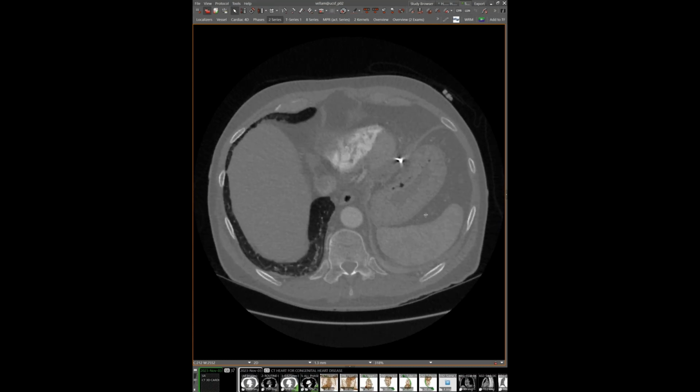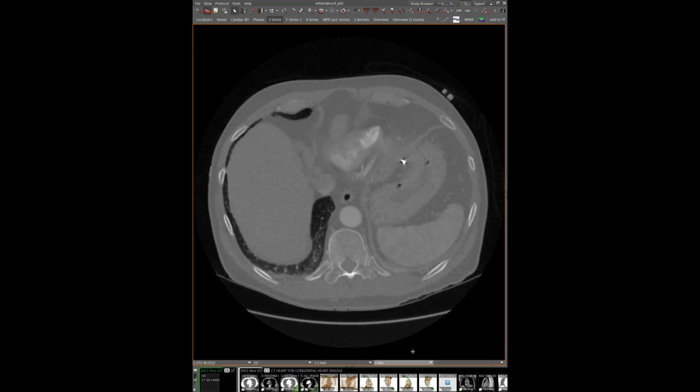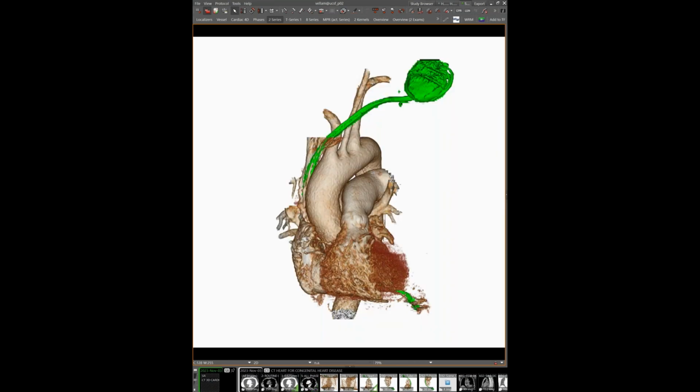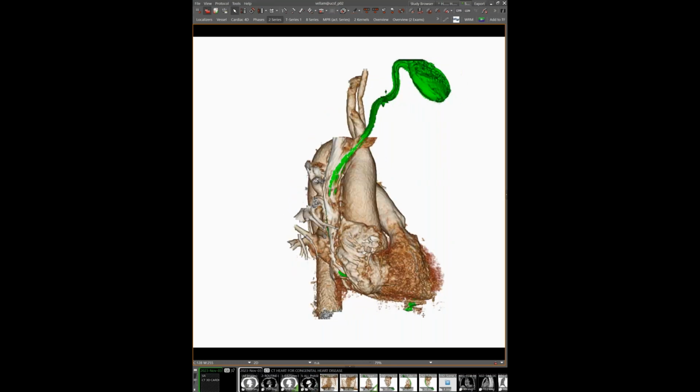Oh. So not ideal placement, but it explains, one, why they're having pain, as well as why their lead is not functioning appropriately. So we even have some nice little 3D images of this going all the way through and then out towards the stomach.